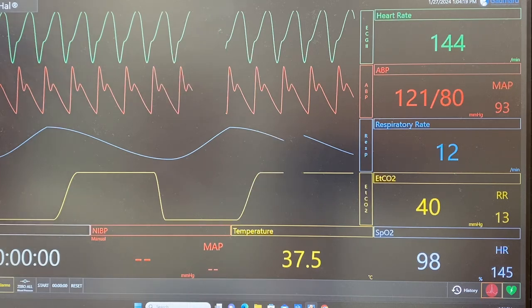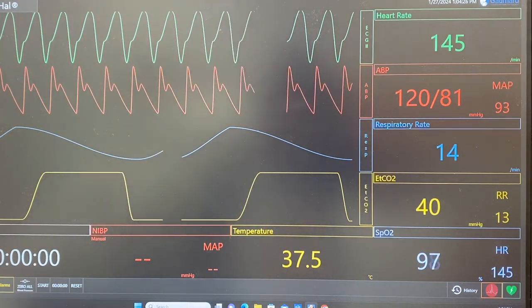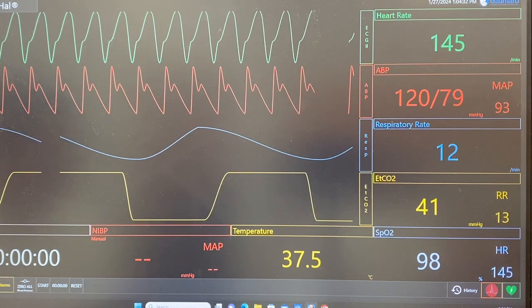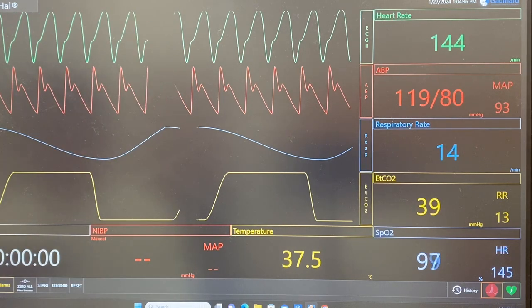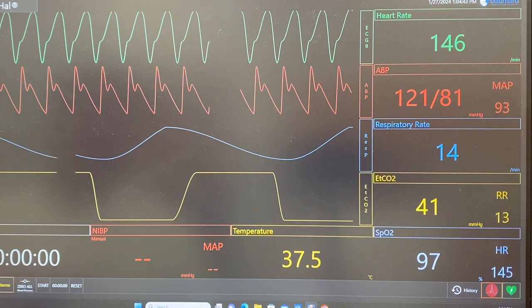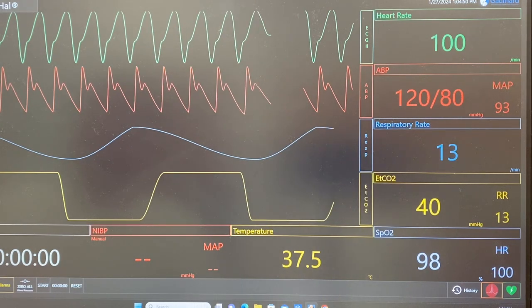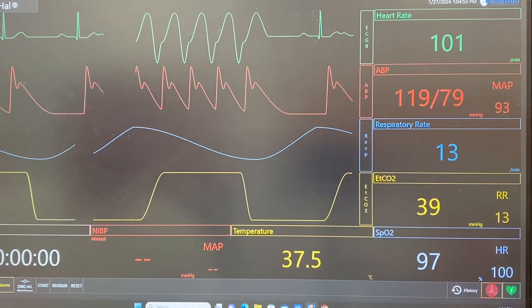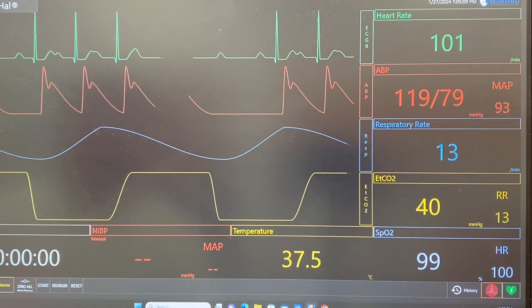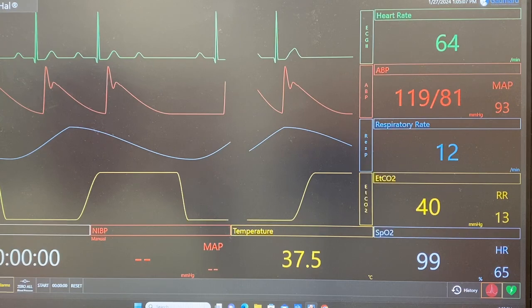Next one. Let's play. Let's see this one here. Going to kick it up a notch for Jessica. Let's see. Make it nice. Hold on. That's not the right rate. Okay, that's better.